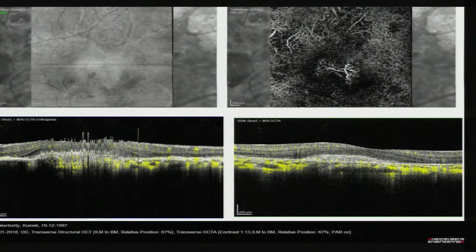Yeah, what is happening is when there is a scar, just adjacent to the scar, there is probably a dehiscence. So we are actually seeing type 1 choroidal neovascular membranes in many of these patients. To begin with, they may have very small microcysts in the retina. We have both groups of patients. Some we have treated, some we have not treated. Those whom we have not treated have progressed on to develop fluid subsequently and worsening of the vision. Probably this helps to treat early and get better results. That's right.